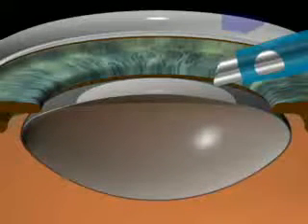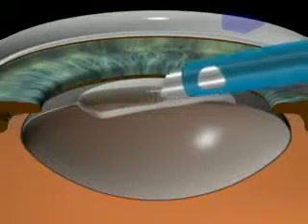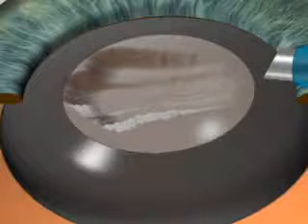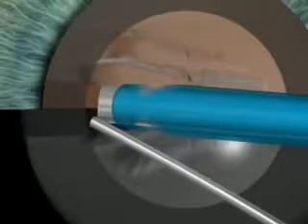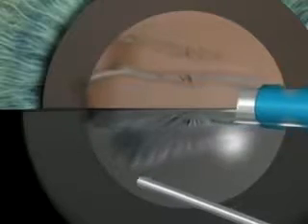Phacoemulsification. A spatula and the phaco tip are inserted through the incisions. The phaco tip starts the downslope sculpting. As downslope sculpting proceeds, a deep trench is created in the center of the nucleus. The instrument tips move deep into the trench and the lens is cracked. The cracked lens is then rotated and cracked again until 4 quadrants are left.